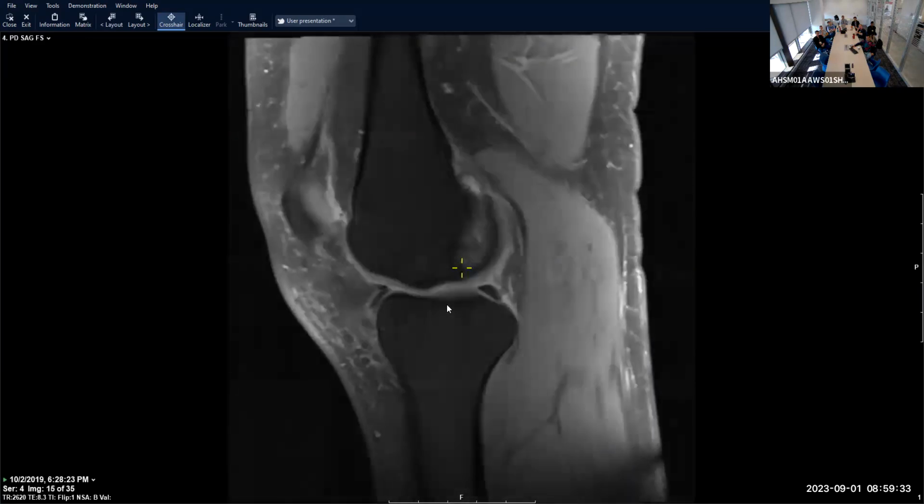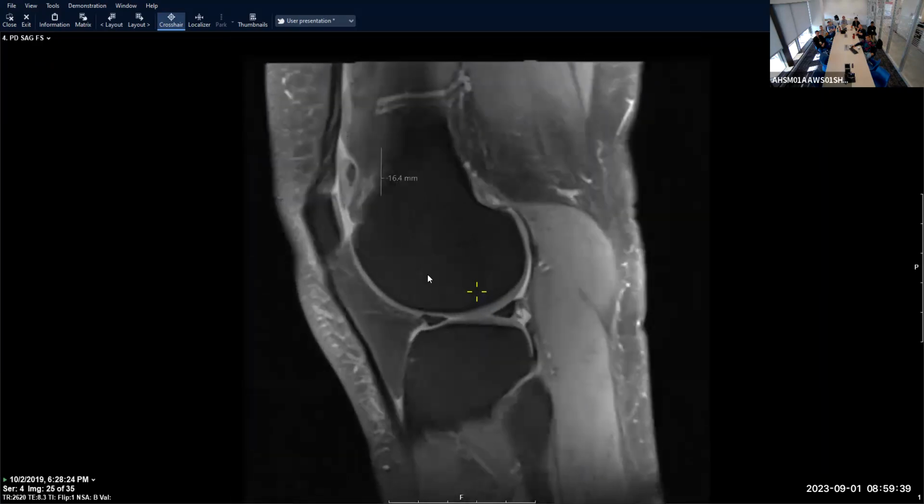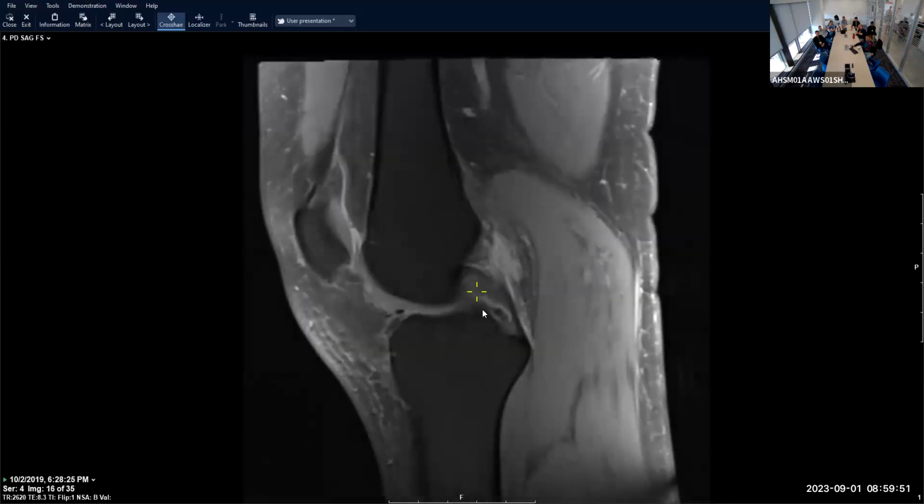And then we want to be searching for the displaced fragment because sometimes they can use that, it seems. Whatever it is should match the signal intensity of bone and cartilage, right? So here we go, bone, bone, cartilage, cartilage. There's a 16 millimeter fragment, and it looks like you could just plop that thing right back in there, hopefully. I'm pretty sure it's not that easy, but.